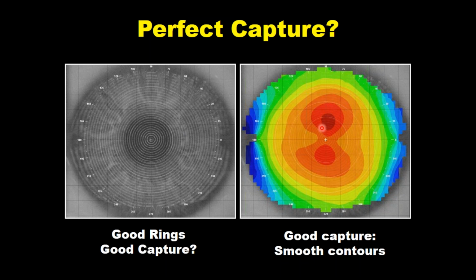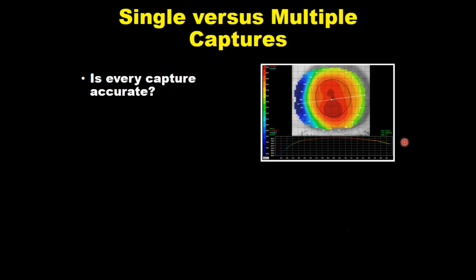So similarly, the topography should show these beautifully well-rounded contours going from steepest to flattest. You shouldn't see any radical curvature changes, 90-degree angles, or a high point next to a low point. It should appear gradually flattening from center to periphery. That tells me this is most likely a good topography.